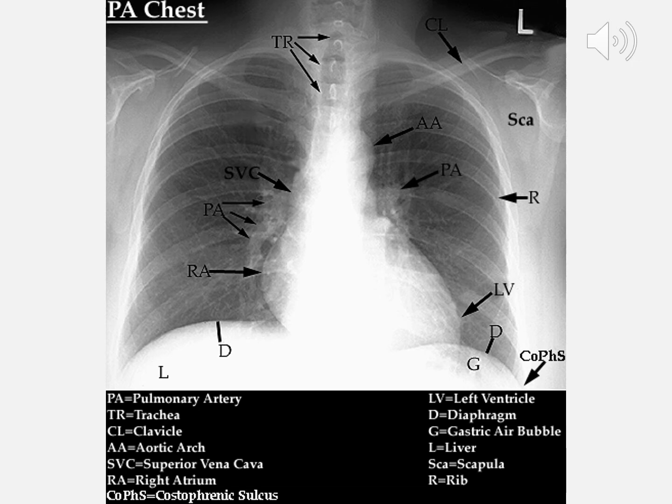A lot of times when you're new interpreting chest x-rays, you'll see this and maybe want to think it's an infiltrate or something, but it's just the pulmonary arteries. You'll also see these little round, circular, whited out dots bunched up with the pulmonary arteries, and all those are cross sections of the arteries that are running towards and away from you, for lack of better terms. So you'll see these little circles, they look like nodes or something, and they're simply just cross sections of the arteries that are running horizontally to and from you.